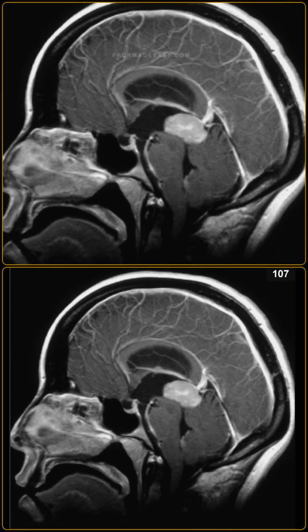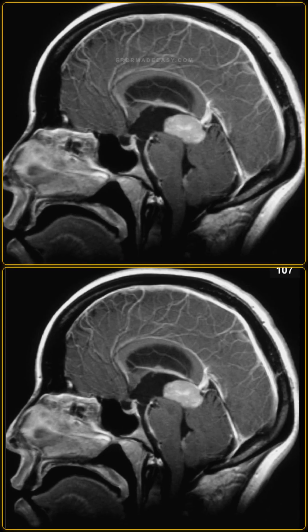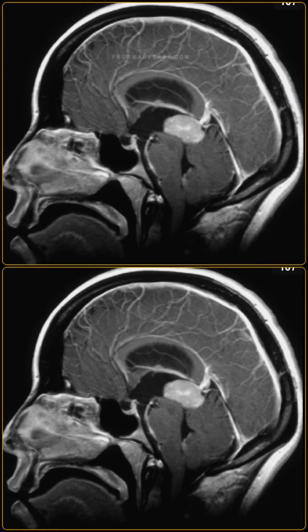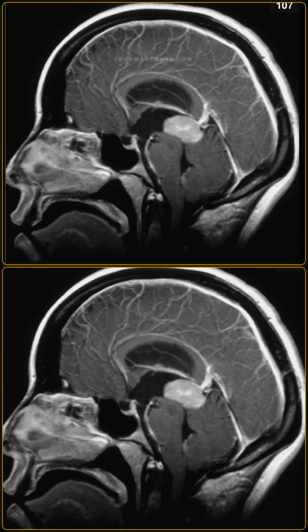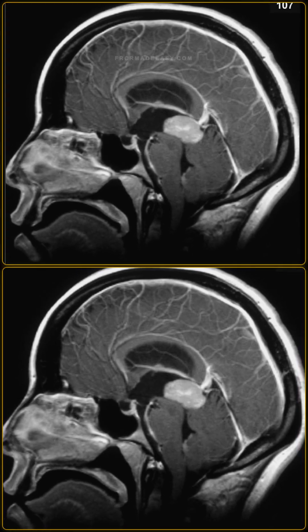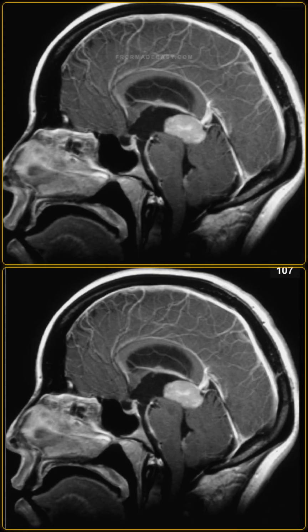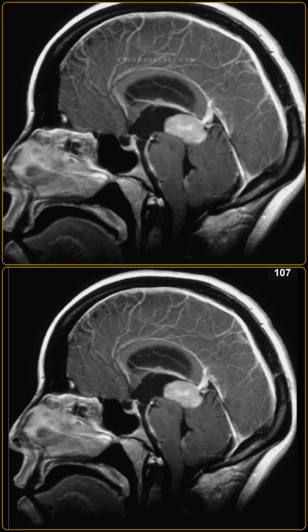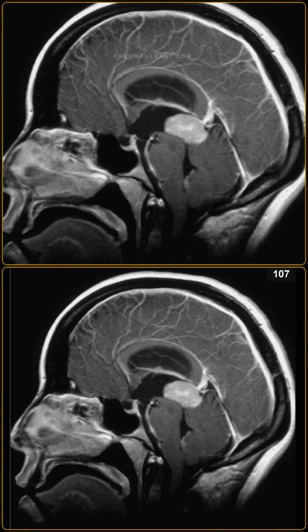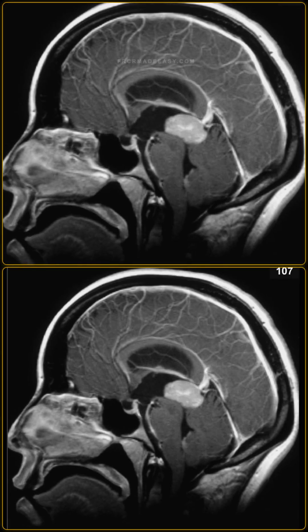Describe the significance of calcification size in this region and how it relates to patient age. Pineal calcification is a normal physiological finding in most individuals over the age of 15. However, when calcification is detected in a child under the age of 6, it is highly suspicious for a pineal neoplasm. Furthermore, a calcified pineal gland exceeding 1 centimeter in diameter at any age should raise suspicion of a pathological pineal mass.